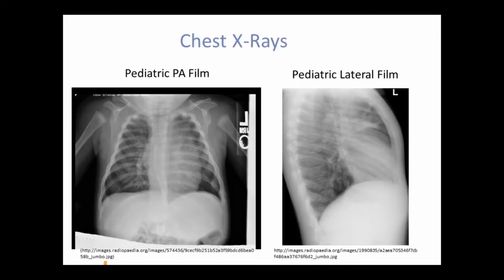Please feel free to pause the video at any point if you would like to take a stab at interpreting the X-ray or coming up with a diagnosis prior to the big reveal. Now, let's jump right into it.